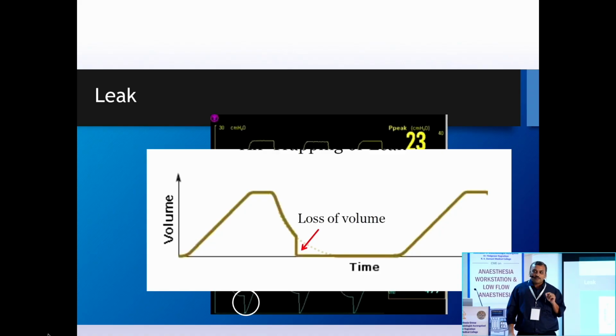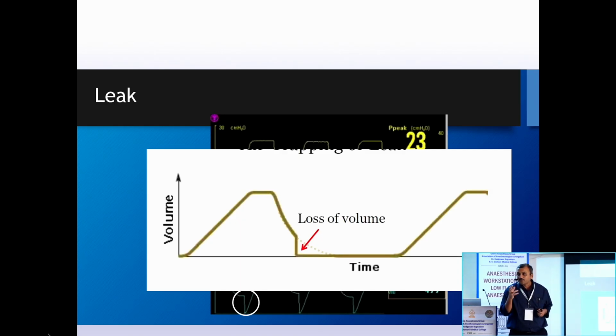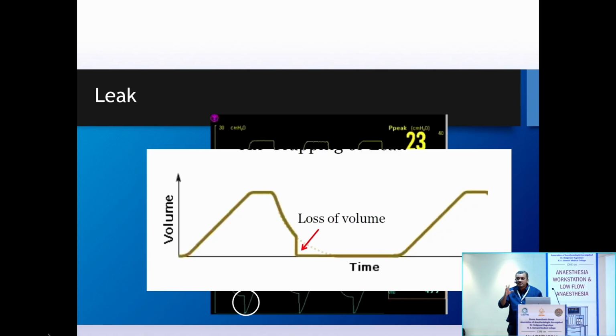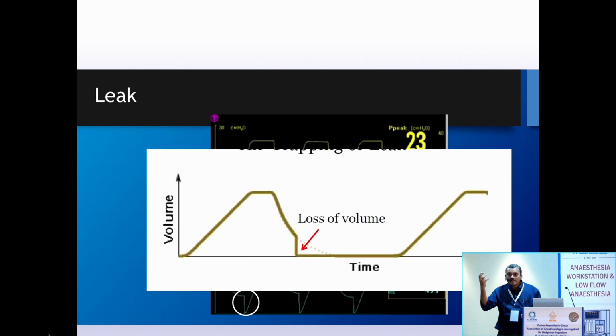Especially when we are talking about low flow anesthesia, if I am getting 100 ml of leak and I am not able to understand it, then it's of no use, because whatever you are doing, it's causing a big amount of leak, isn't it? So understand this from the scalar. The second way to understand is VTI and VT. As sir was saying, there are two sensors nowadays in most modern anesthesia machines. VTI is inspiratory tidal volume, and VT will be your expiratory tidal volume.